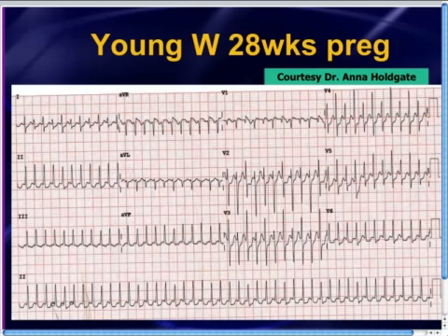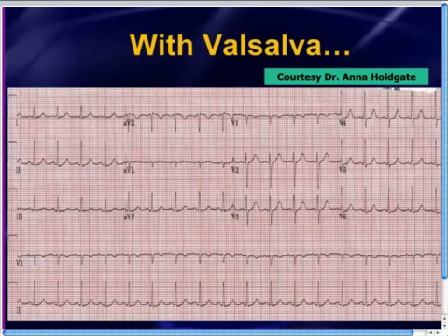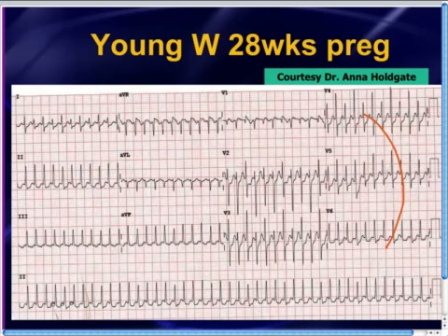All right, second point that I want to make here is you'll notice that in the lateral leads especially, you've got ST depression. Some people might say, oh my gosh, maybe this person needs a stress test or needs to be worked up for the ST depression. It turns out that when that has been studied, ST depression in the setting of SVT has no clinical significance. They do not need to get a stress test or cath just for that ST depression. ST depression is very common and expected and has no clinical significance in patients with SVT unless after conversion it persists. And you can see that the ST depression went away once they converted. So the ST depression really doesn't mean anything.